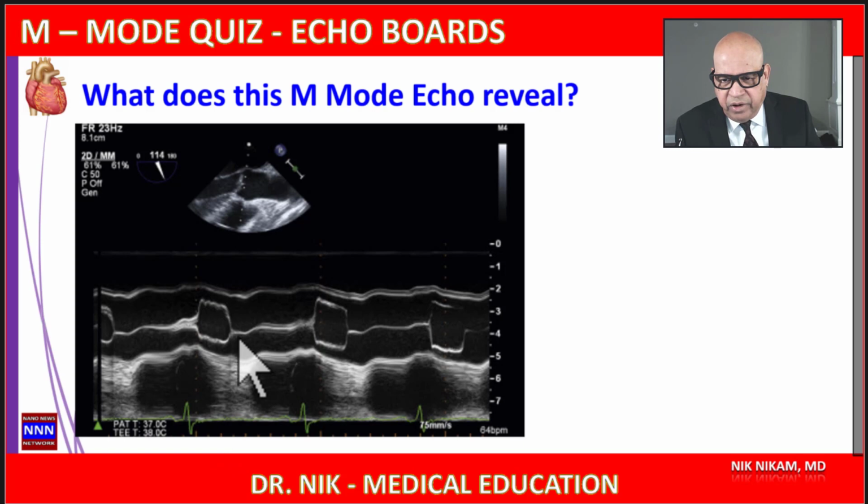And look at the movement of the aortic root. The aortic root movements may be subdued in patients with low cardiac output. So that itself gives you an idea as to the status of the left ventricular function.